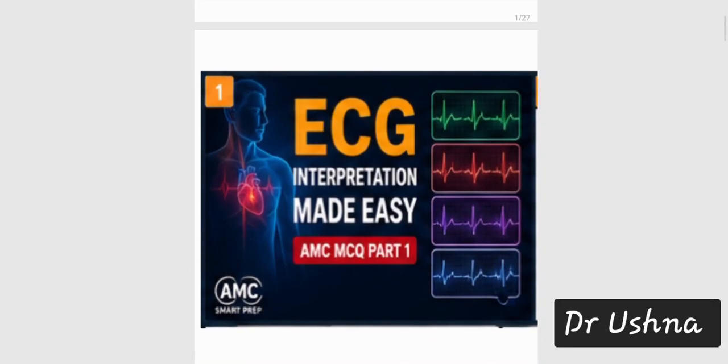Whether you are talking about PLAB, AMC, USMLE, or simply looking to strengthen your clinical skills, ECG interpretation is a very essential competency for every healthcare professional. So in this session, we will break down ECG interpretation into a simple, systematized approach, and help you identify the normal findings and recognize the common exam-worthy abnormalities with more confidence. So be with me till the end for the important tips and practice with examples, and you will be able to interpret the ECGs that are very essential for your exam.